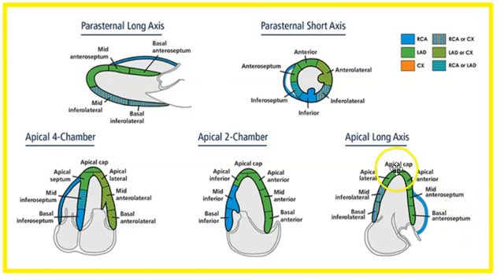And we can see that we have the apical cap, apical anterior. Now, I want you to look at something as I do this. Mid-anterior septum, basal anterior septum. Look up here. Apical cap, mid-anterior septum, basal anterior septum. This is essentially the same cut as that one, just a little different angle.